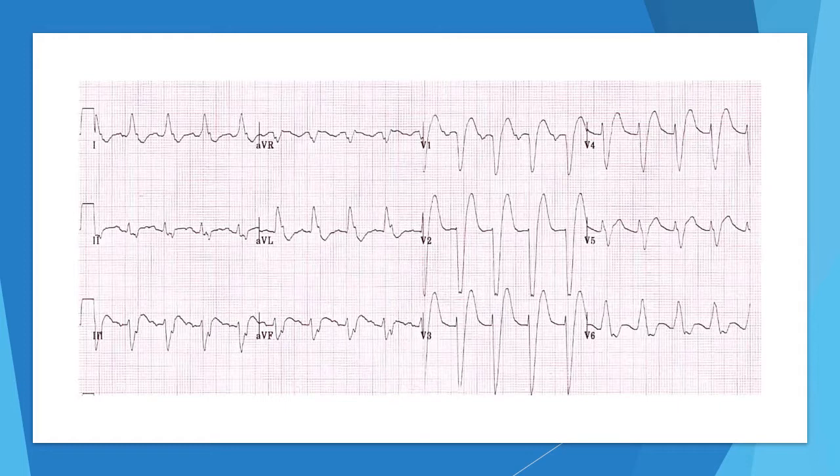And again, just like most things, I don't teach the tricks because I feel like it robs the provider of learning comprehensively what's actually happening in the patient. And when we start comparing these, especially when these get fast, if we're trying to compare between VTAC and either a left or right bundle branch block, it's imperative that you understand in detail which is which, because the VTACs will mimic these bundle branch blocks, and there are only subtle differences to help you determine which is which, and that can be important when we start talking about treatment of a tachyarrhythmia.